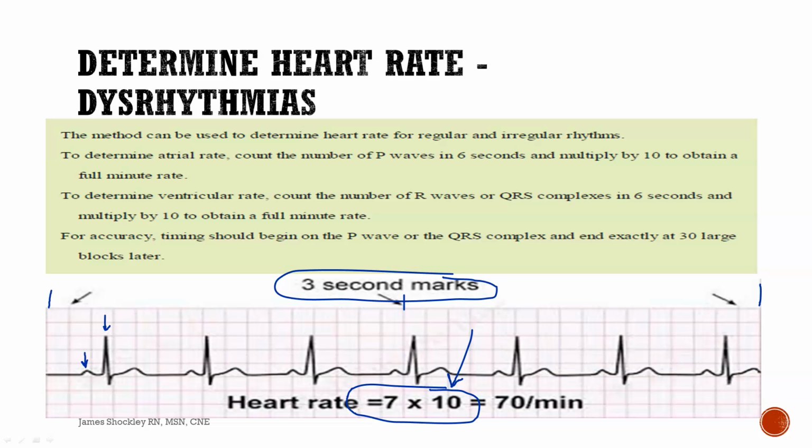Why is it between 70 and 80? Because you have extra time here and a little extra time there. Right? Well, I guess there's not a whole lot extra time because that's the T, but you get the idea. So this is probably really like 73-ish heart rate. It would be impossible for me to ask you to do that. I'm going to show you later on a better way to do it, but it's a more ACLS type of thing to do. If you can tell me that that heart rate is about 70, you're doing exactly what you're supposed to be doing.